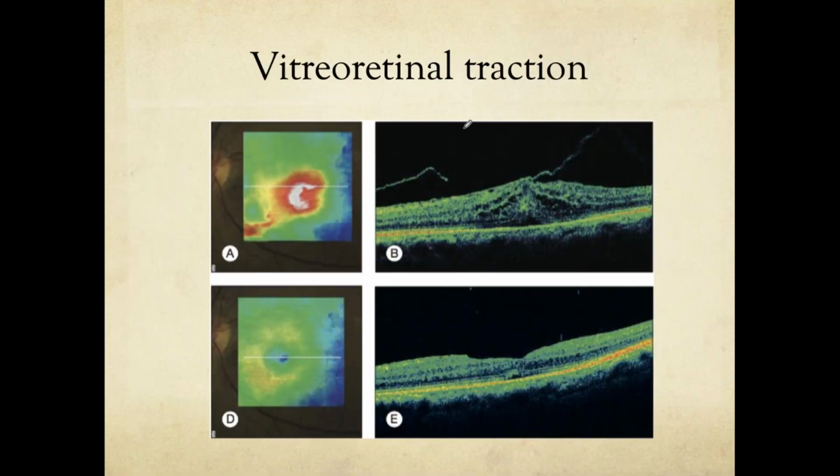So again, vitreoretinal tractions, see the macular edema. Then if the traction is too much, you have to do vitrectomy. Even if somebody shows me this eye and says that the patient has vision of 6/18, I would still say that this eye needs to get vitrectomized early because of the traction. The splitting has started, you see, splitting has occurred.